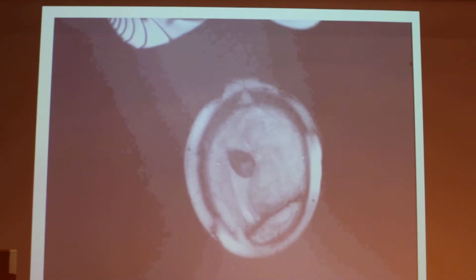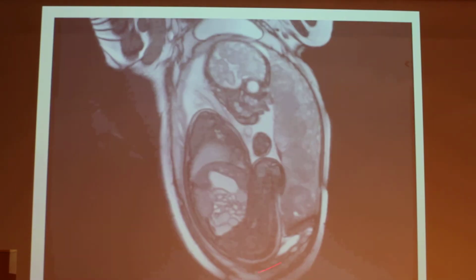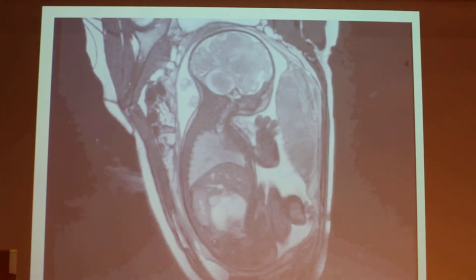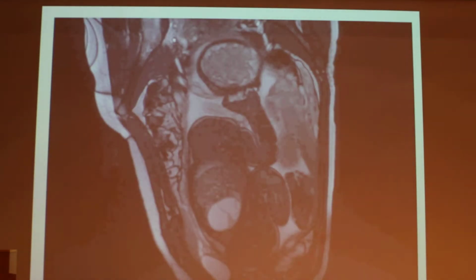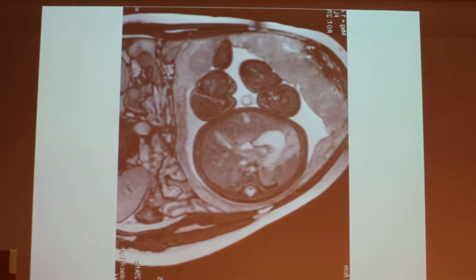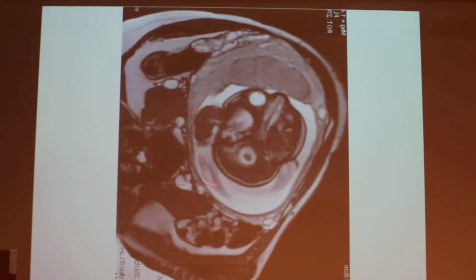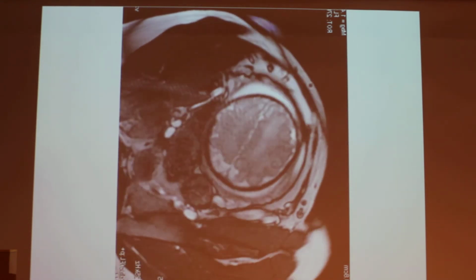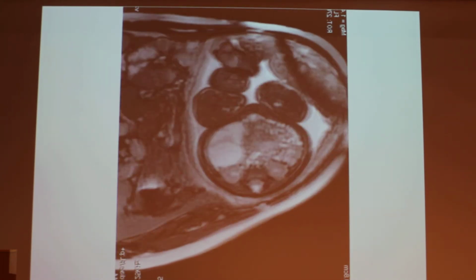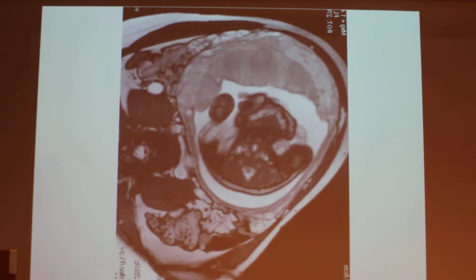This is mainly because of the very large field of view of MRI. You can assess the anatomy either on sagittal views or on axial views very quickly and very efficiently. And for those of you who are quite used to the normal examination of the fetus, you can see that on almost 1 sequence you can see almost everything in that fetus, including the arms and legs, etc.